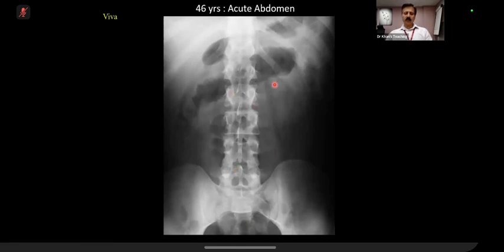So if you see here, normal transverse colon has got haustra, and this thing should be in your mind, in your description in the exam. Loss of haustra. Remember that. The loss of haustra. Number two is, if you see, these are thumbprints, right? Loss of haustra, there is thumbprint here, and maybe a pseudopolyp.